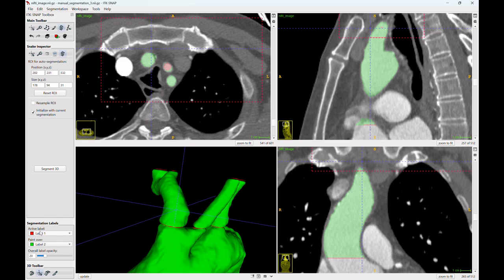Restrict the propagation. Make sure that label 1, the red lumen, propagates only within label 2, which represents the green thrombus. This ensures that the snake does not extend into adjacent regions, with similar intensity values, that were not segmented under label 2.